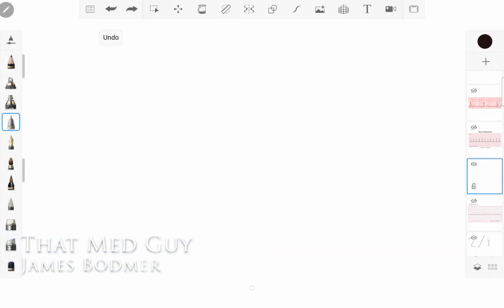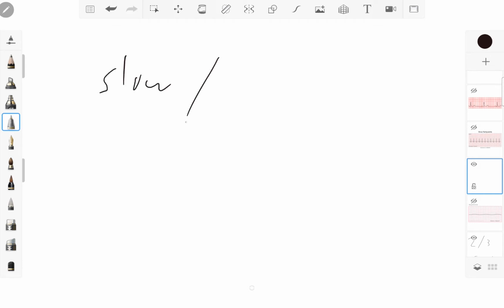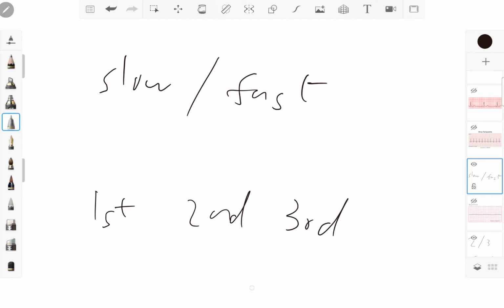Today we're doing part 2 of the 3-part series. Today we're going to be doing slow rhythms and fast rhythms, and those first degree, second degree and third degree heart blocks. If you didn't watch my previous video on basic reading of ECGs, I'd recommend you watch that first, but let's jump straight in.